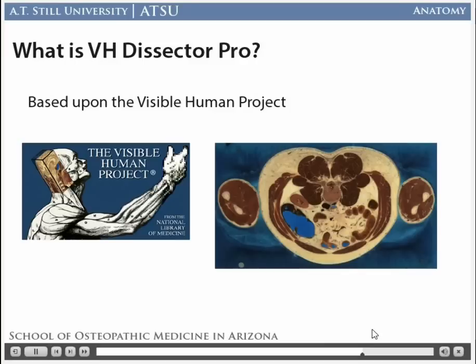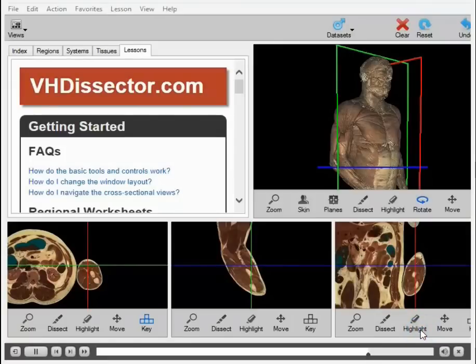Again, I could talk for hours on what this program could do, but instead, we should just launch the program and demonstrate what it can do. Please click on the icon that launches VHDissector and then hit Continue. VHDissector can be kind of intimidating.